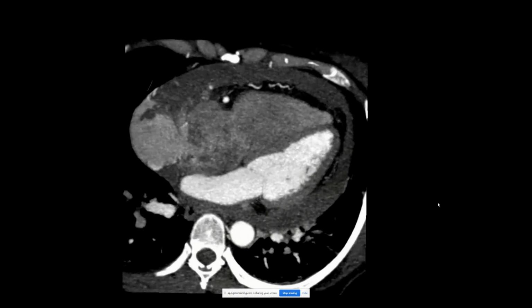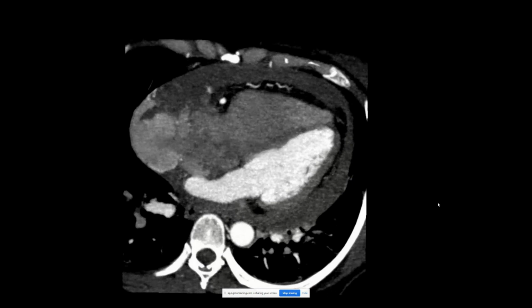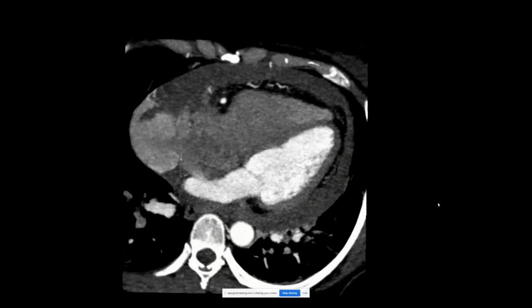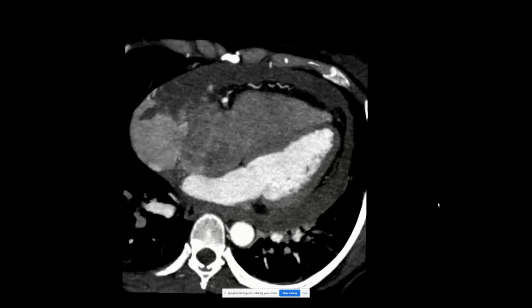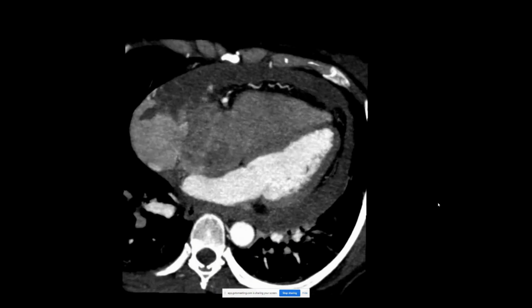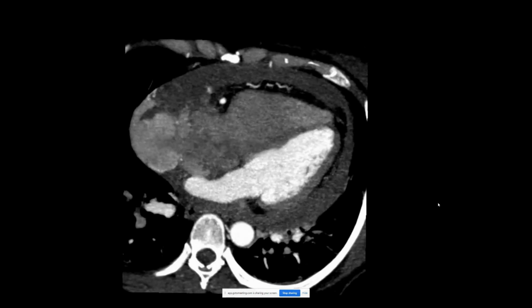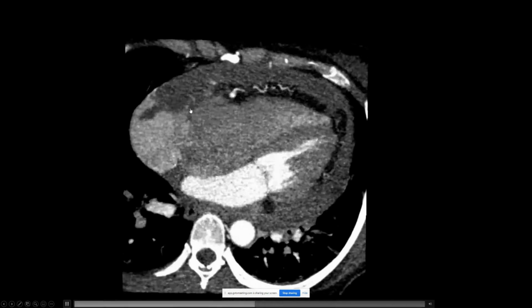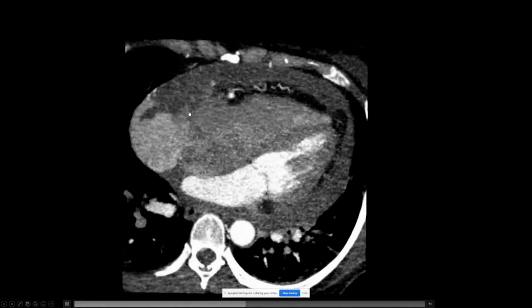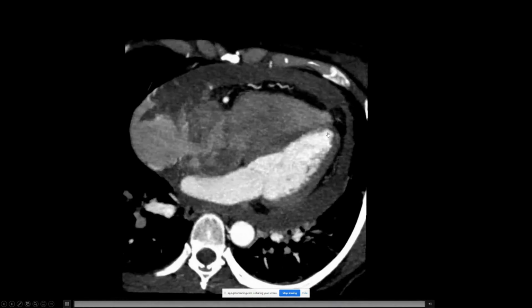And here's one that actually presented with a frank rupture of a right atrial angiosarcoma. What happened was this person had a recurrent effusion, was taken to do an echo-guided pericardiocentesis, and then kind of crumped on the table. They got a transthoracic echo and saw free-flowing blood back and forth across the right atrium. I said, oh my God, I think either we lacerated the right atrium or a coronary artery with the needle. The patient actually stabilized pretty quickly with the drain placed, so they sent her over to CT to get a better anatomic definition.